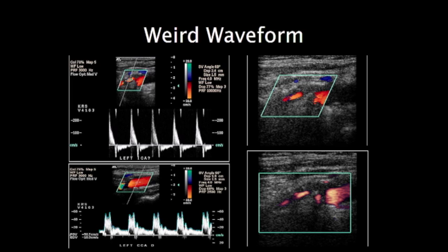So this is, it looks to me, thank you, was that Mindy, I believe? So there's a lot of stuff in here. Dissections as a rule are a hemorrhage in the wall. This kind of looks a little more irregular. And this patient is 78 years old. So dissections are a good thought. It's one of the things that can give you a highly pulsatile Doppler waveform.